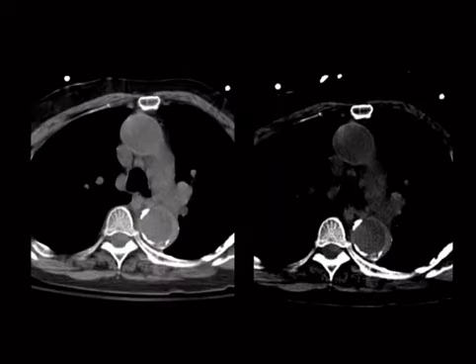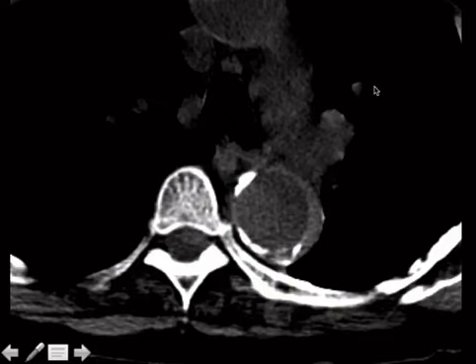So here's the next case. We'll do a zoom up. This is a non-contrasted study, and this image is just windowed more at like a liver window or a subdural blood window. Take a closer look here. Notice that there's this hyperdense area right here, which is abnormal. If you haven't seen this before, now you have. This is acute intramural hematoma.